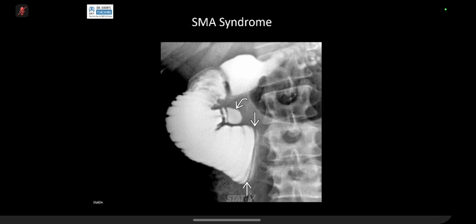On a barium examination, this is a classical picture where you will see a band here and you will see some dilatation. This dilatation will not be complete. This obstruction will not be complete. It will be transient. When we do a fluoroscopy, we call it a to and fro movement of barium. We write it in our reports. We will see that barium will come here, barium will go back, come here, go back, and then it goes into the jejunum, to and fro. So it is subacute.